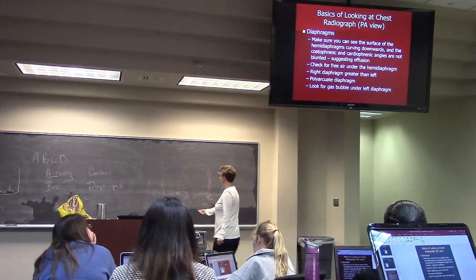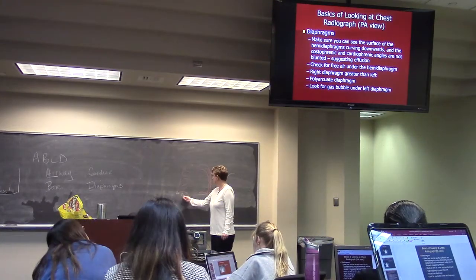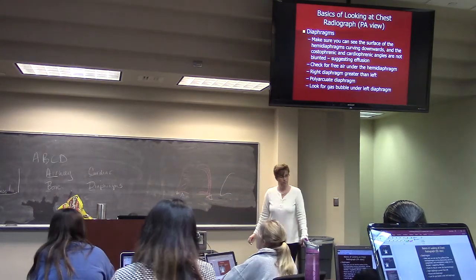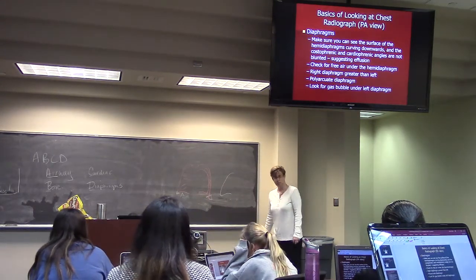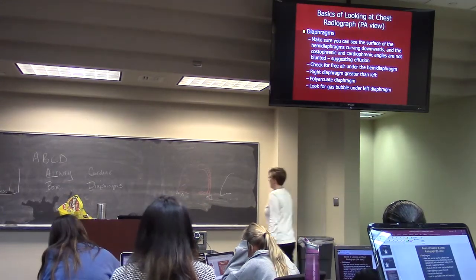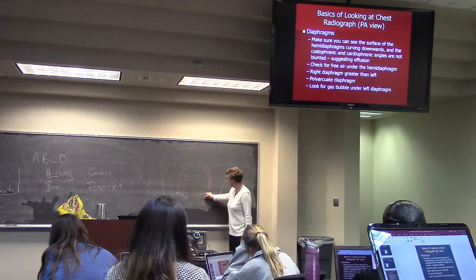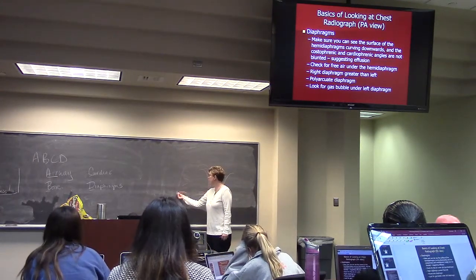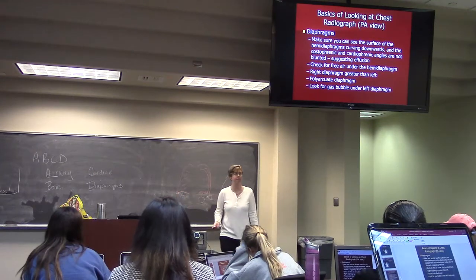The right is always higher. You want to look for that gastric air bubble that's there. But what I don't want to see is air underneath a diaphragm.